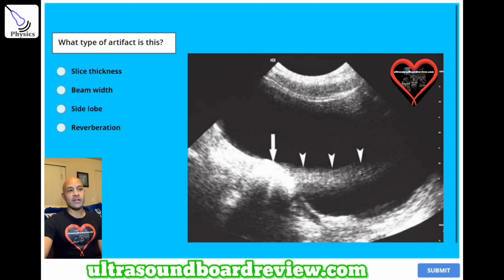So what type of artifact is this right here? The answer is C. Side lobe.